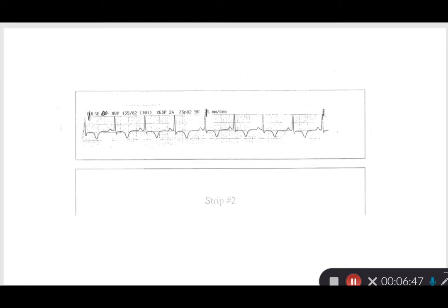All right, looking at this next one, I see those inverted T waves again. Right off the rip, I can tell these T waves are flipped upside down, so it's something I'll definitely want to note in my name. Let's go ahead and figure out our rate. First of all, it does look very regular, so off the bat, that's something we want to determine.